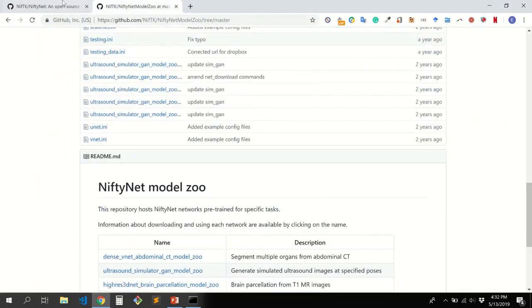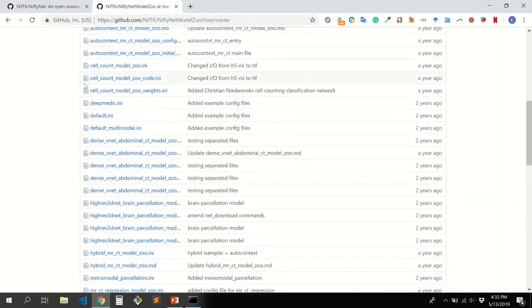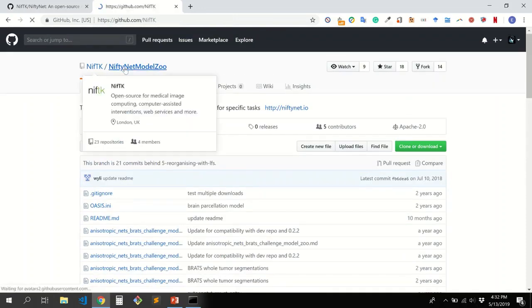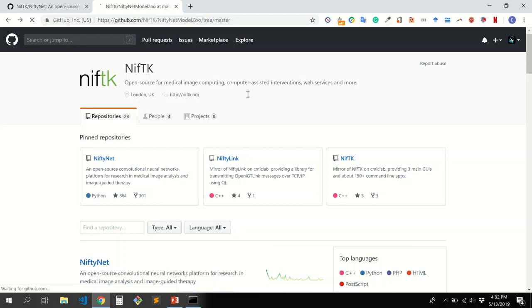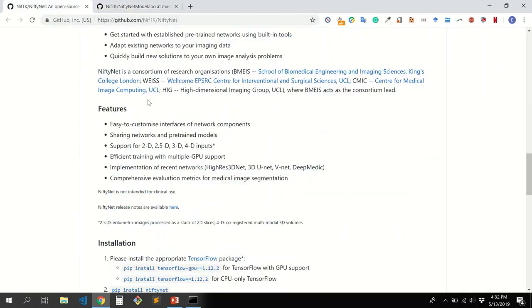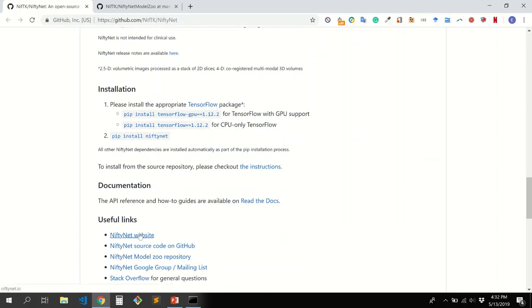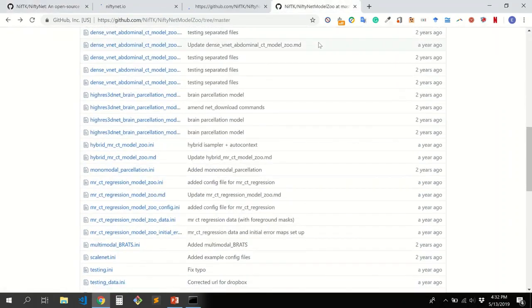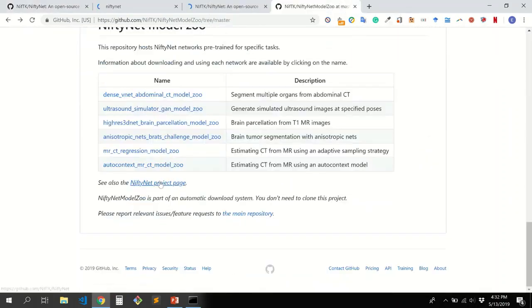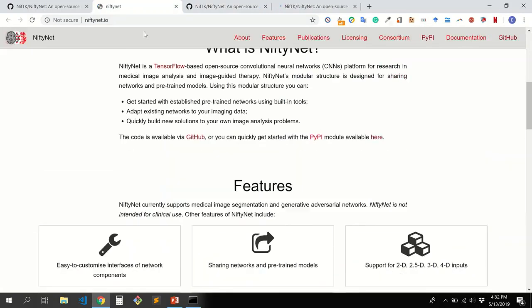Okay, we're using the quick start. Where is the quick start here? Let me find the first page. No, this is the company located in London that created this model. TensorFlow. No, it is not here. Website. I don't remember which page it is. I generally open several tabs to work all the time, so it's a mess, and also the pop-up message. Okay.